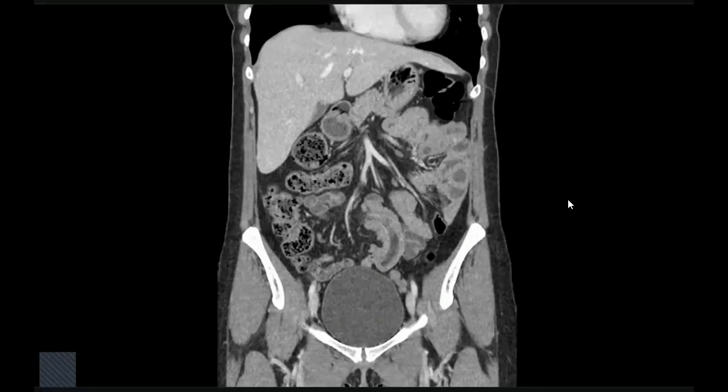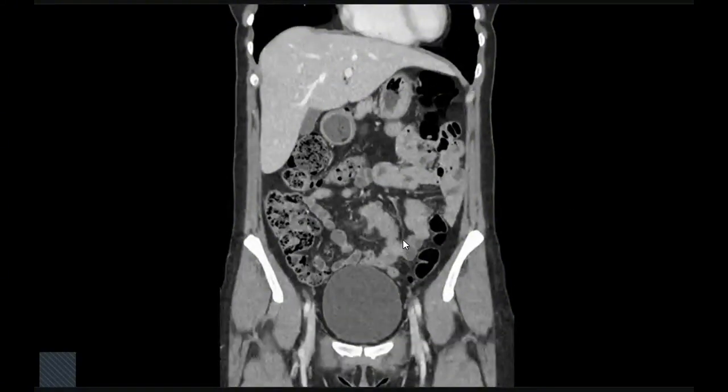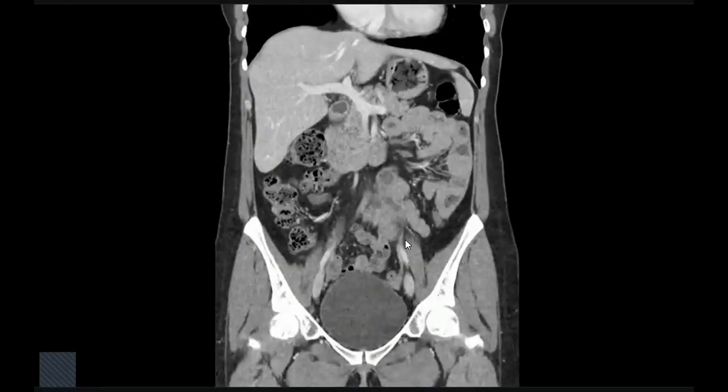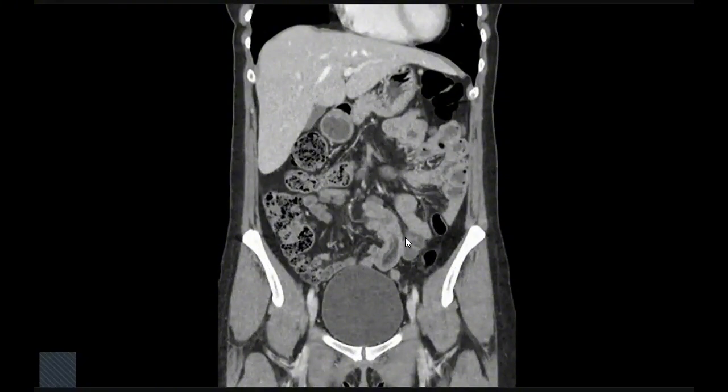This is the point that I'm thinking about. I was thinking why the lipoma is oblong and elongated like this shape. Anything else come to your mind with this shape?